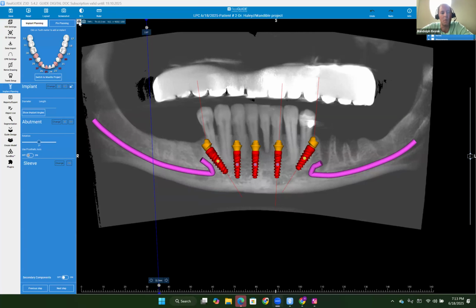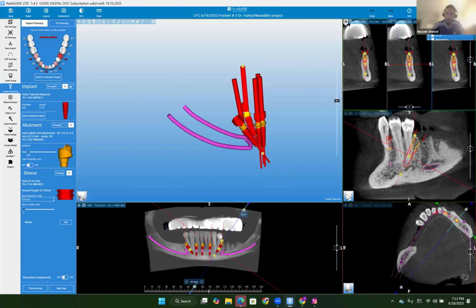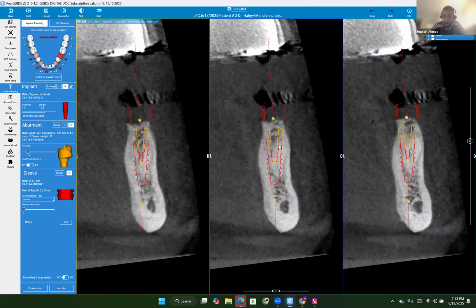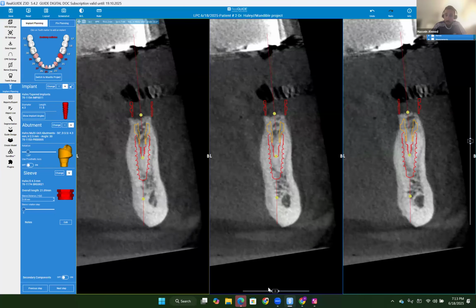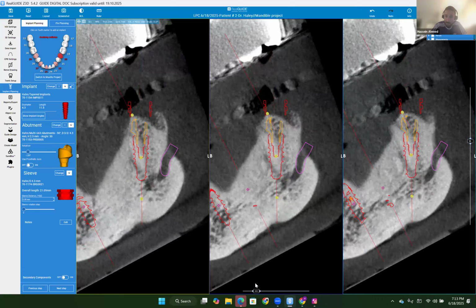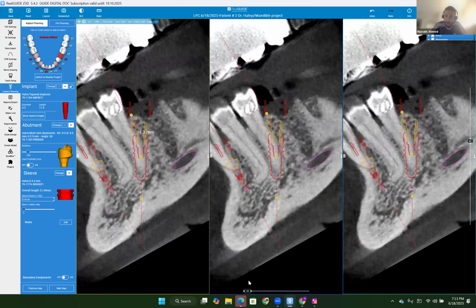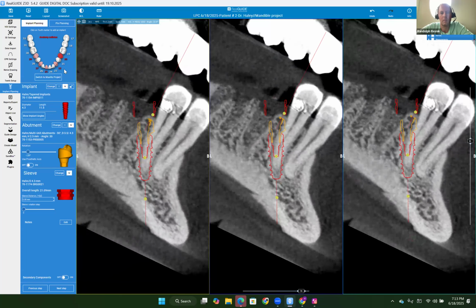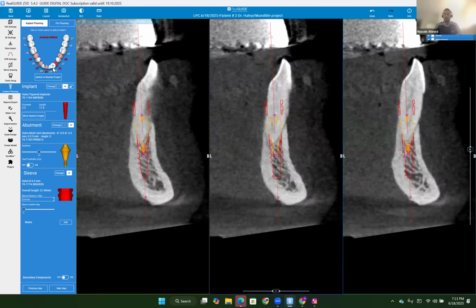So you want to go through these one by one here, Hussein? Right away, sir. That's our first implant, Dr. Resnick. I do have an implant at the site of E. That's a 4.3 by 11.5 millimeter long implant at the E position, sir. Good bone coverage to the facial and to the lingual aspect of this fixture. I'm perfectly clear, Dr. Resnick, away from where the mental foramen and the anterior loop anatomy is. And that's our first implant at the E position. Next one, sir, is the site of number 22.